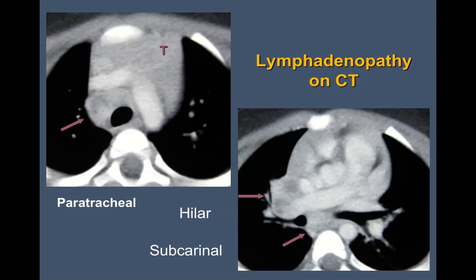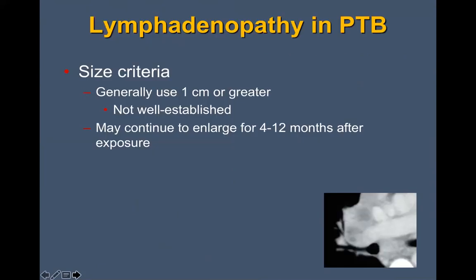It's not very well defined enhancement. It's sort of hazy enhancement, and some people have called it ghost-like. Doesn't look like a ghost to me, but it basically means that it's faint peripheral enhancement. But that is not necessarily pathognomonic, but is quite characteristic for tuberculous lymphadenopathy, both in the chest and in the abdomen.